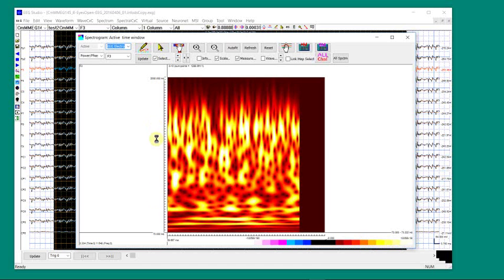This is the frequency. That means from 70 to 2000. That's what we selected. This is the time window. Because we used sequential or accumulated spectral power, this time window is much shorter than the original time window. That's why we come here.